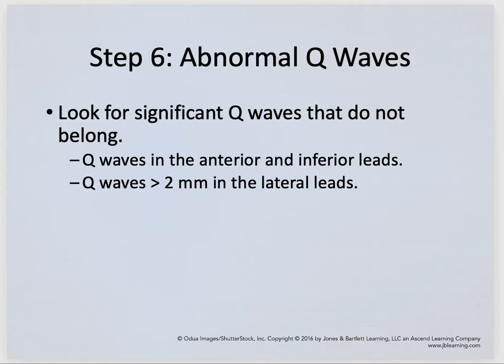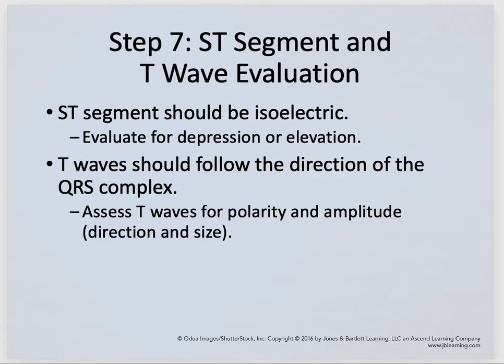And we'll look more at Q waves as we move through, but you just want to note with your eyes, in this very systematic way of looking at an EKG, is there a Q wave? Yes, no. The seventh step is what's going on with the ST segment. Remember I used the word isoelectric, flat, parallel, flat line, the ST segment.